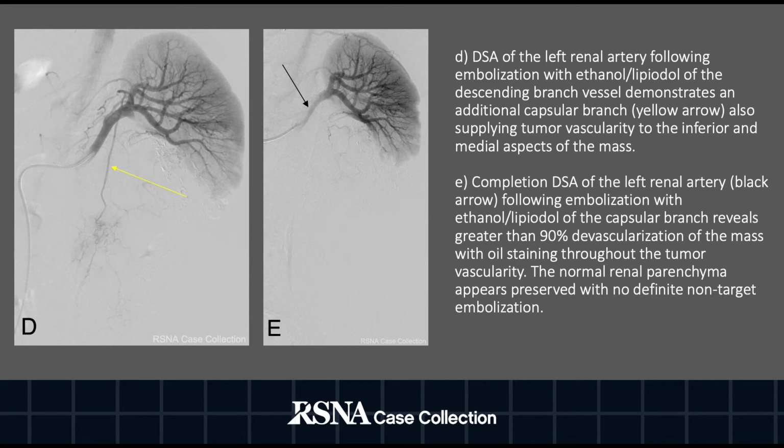The image shows greater than 90% devascularization of the mass with oil staining throughout the tumor vascularity. The normal renal parenchyma appears preserved with no definite non-target embolization.